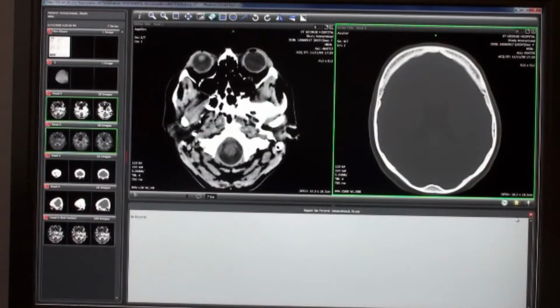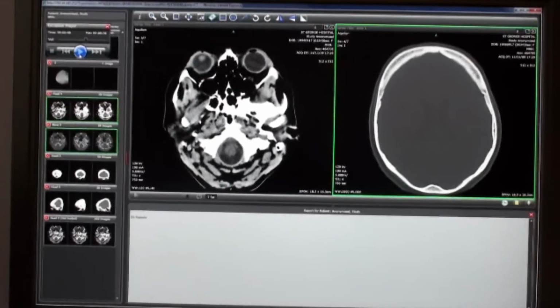One of the advantages that Merlin Web provides is the ability to display a report in dictation form. So clicking on this button will bring up the audible recording made by the radiologist. So if the report has not yet been finalised, it's possible to hear the radiologist's report over the internet. Just as an example.